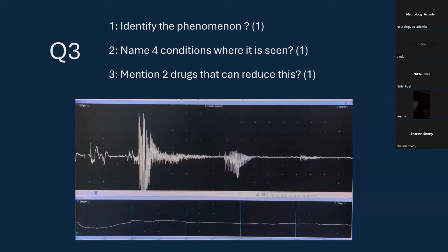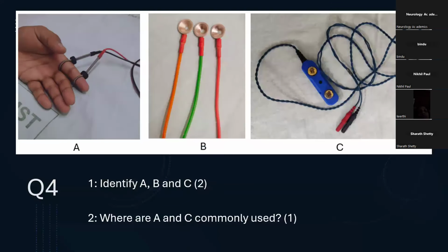Next question. Identify these electrodes A, B, and C, and where are A and C commonly used?